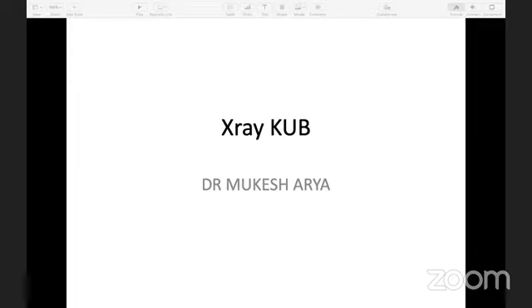I am speaking on uroradiology covering X-ray KUB and IVU. KUB here stands for kidneys, ureter and bladder. X-ray KUB is a very common initial investigation for urolithiasis and is complementary to ultrasound.